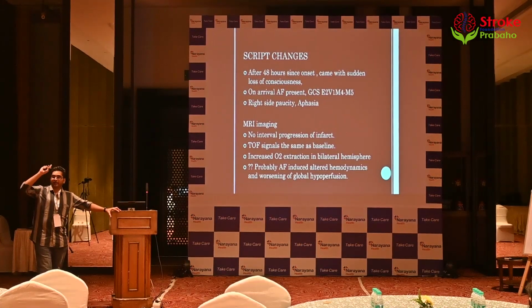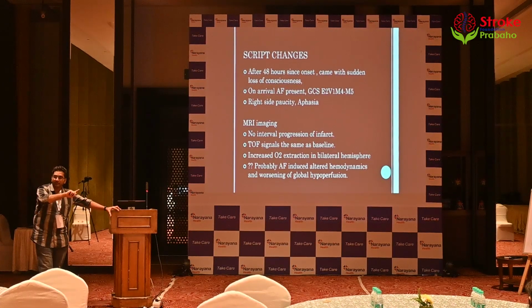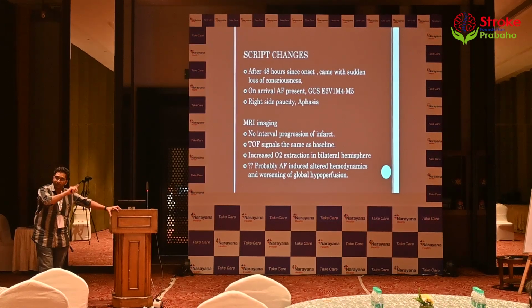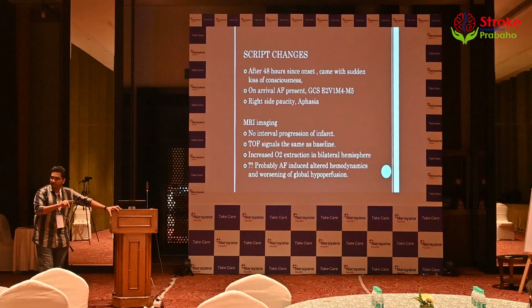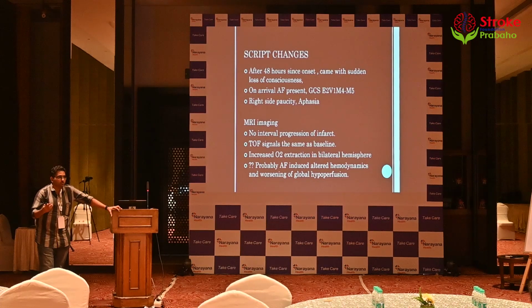We remember there was a right carotid occlusion documented. The ICA was still filling on the MRI. No update on the common carotids, at least on the MR. The left system had infarcts and now he has come with a full-blown left hemispheric syndrome, so to call it, maybe with a hemodynamic component to it.